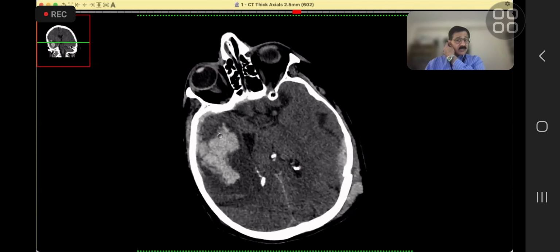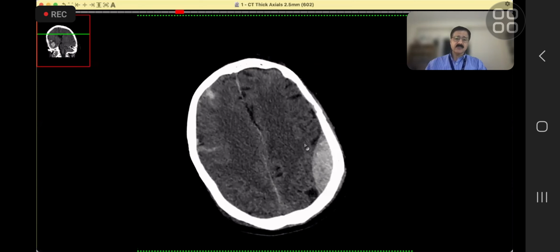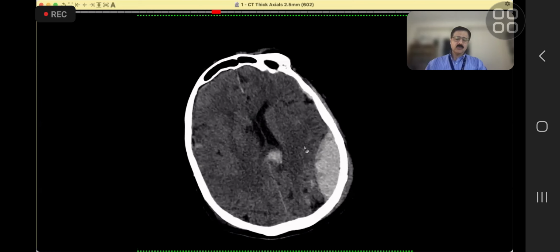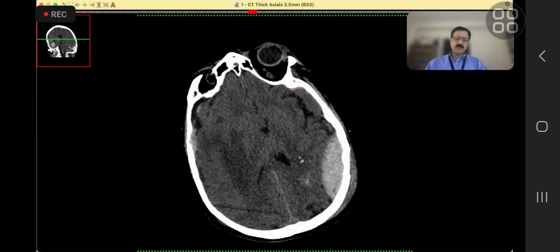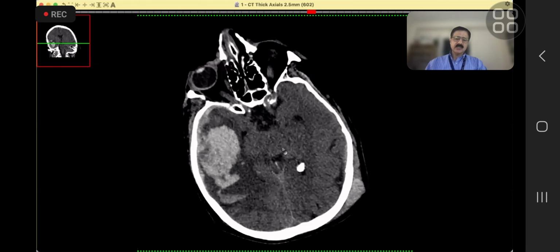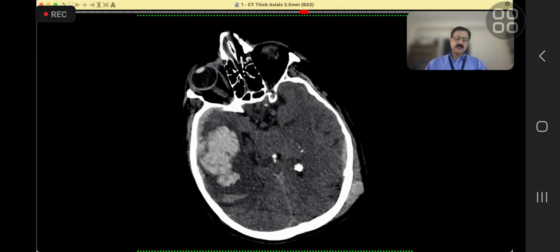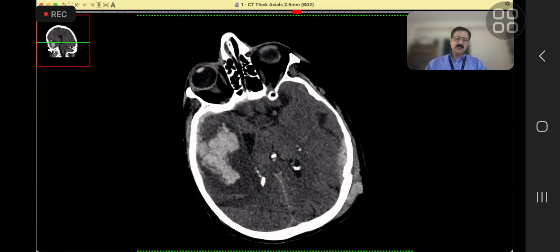And then there is a midline shift. You know, the pertinent positives and negatives are midline shift. This patient also has a lacunar infarction, which is of no significance, but just an observation. Now, there is subfalcine herniation to the other side. And if you see the midbrain here, now this is the ambient cistern, which is slightly effaced and maybe early transtentorial herniation, but no frank transtentorial herniation is visible.